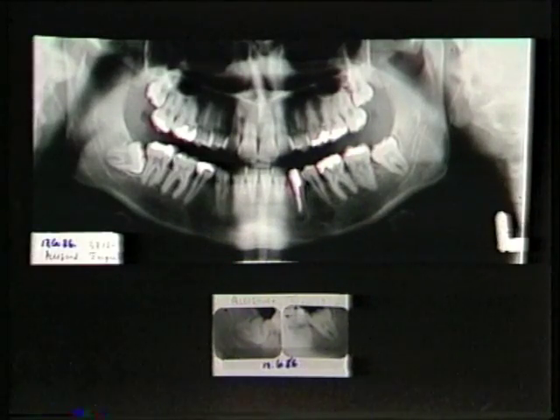An orthopantomogram and periapical radiograph are on the screen, correctly named and dated. This is what they look like. The quality of the radiographs is uniformly good, and having checked when the films were taken, we know that they are recent, so we can proceed. If the quality were poor, or the radiographs were wildly out of date, then new radiographs would have to be obtained. So let's start by classifying the type of impaction.